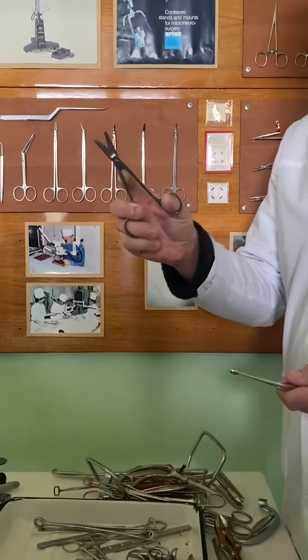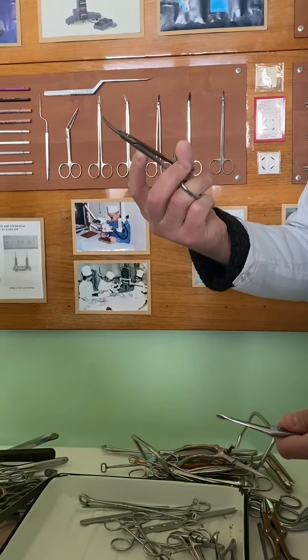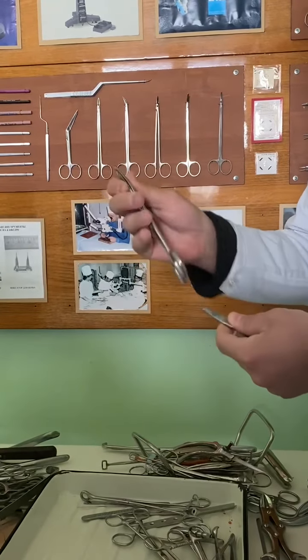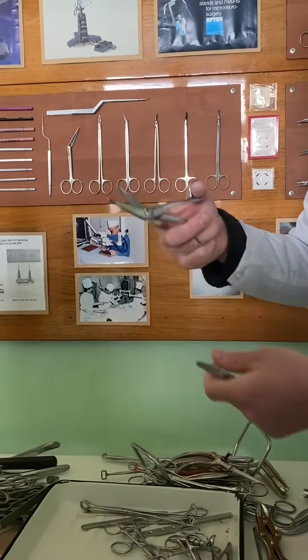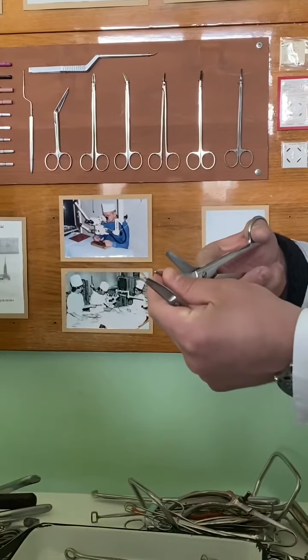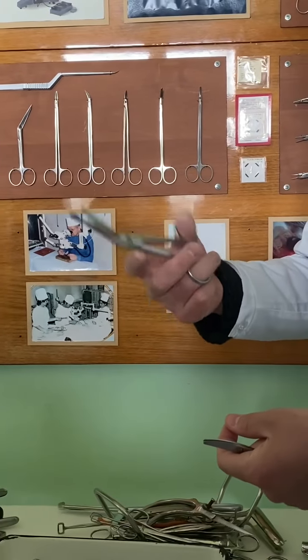Here, general surgical scissors with the name Cooper. Here, they are with blunt ends. There are special scissors for enterotomy. This one has an olive bulb, which protects the back wall from being cut. It's enterotomy, but it doesn't mean that it's only for intestine. Stomach, we can cut it too.